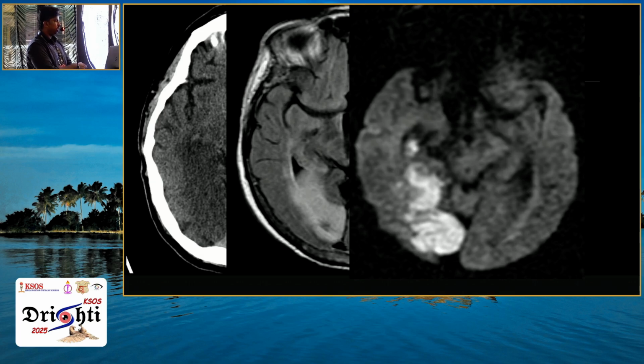DWI is the essential and number one sequence to look for any acute or hyperacute infarcts. This is a DWI image. DWI image itself, it highlights everything that is acute or hyperacute infarct as early as possible.